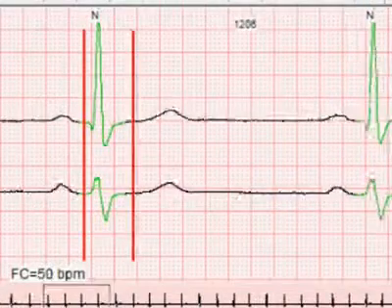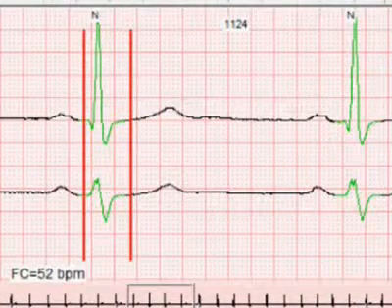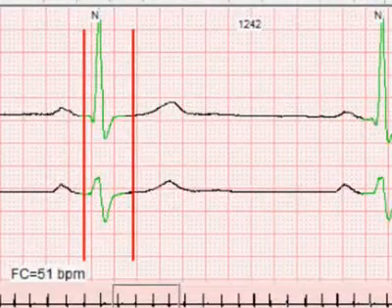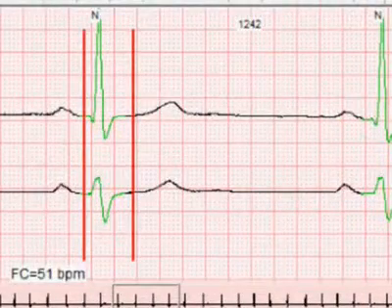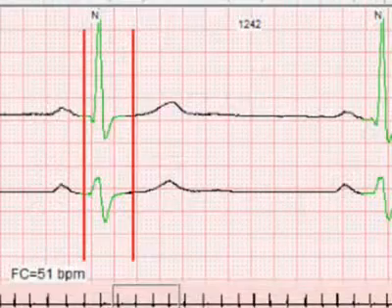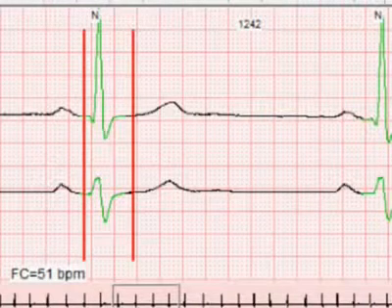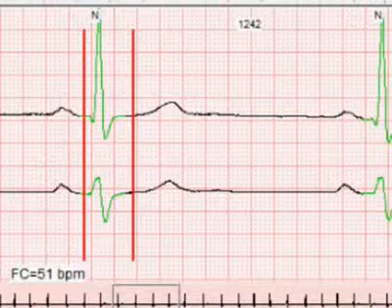To control the position of the sample points, keep the right arrow button pressed. We choose the moments of low heart rate, the end of the night, and moments of high heart rate. The red bar on the left, which corresponds to the reference, should be placed on the time of 0 voltage, by default between P wave and Q wave.